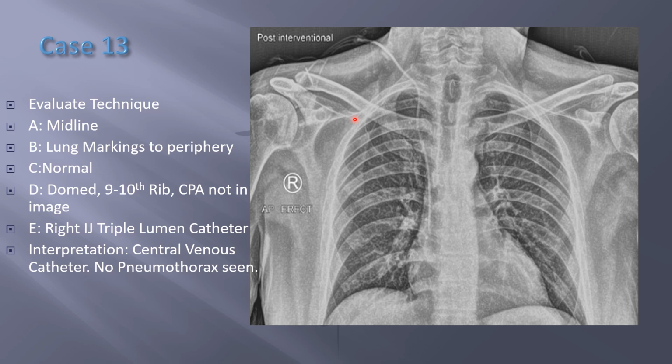So I place these lines in the ICU, and I'll do an X-ray after I place this. I can put one on the left side, and I'll kind of cross over and down, so you want to make sure you use a little bit longer catheter to make this transition over.